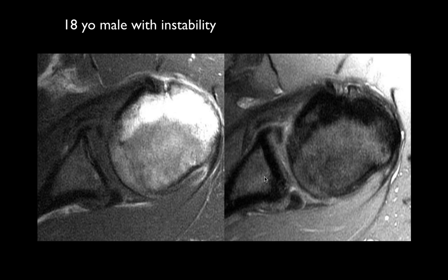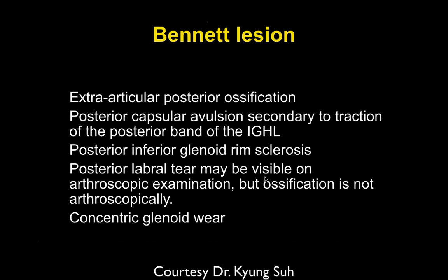Okay, Max, what do you think of this? John, go ahead. Yeah, Bennett, I think his history tells us, in Campbell's anyway, described the calcification, didn't describe an avulsion of the labrum. Yeah, he just described the calcification, right? Yeah.